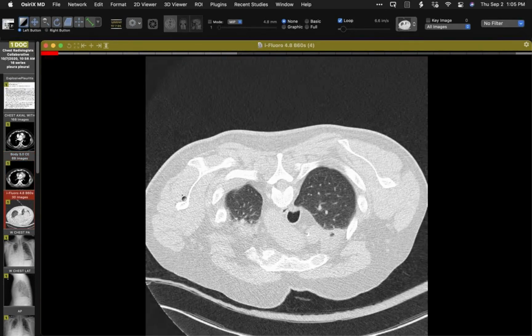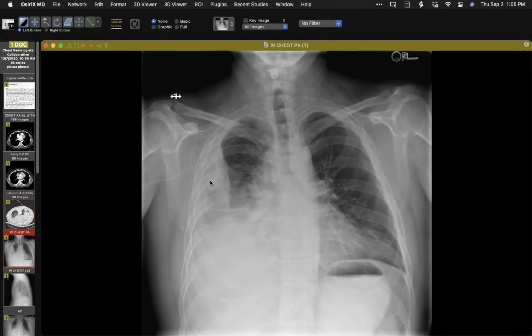That was uneventful, and the biopsy was on the 18th. Here the patient, the next day, has a large amount of pleural fluid. That's a substantial amount, and it developed quickly after the procedure. There's no pneumothorax, and it was not bled.